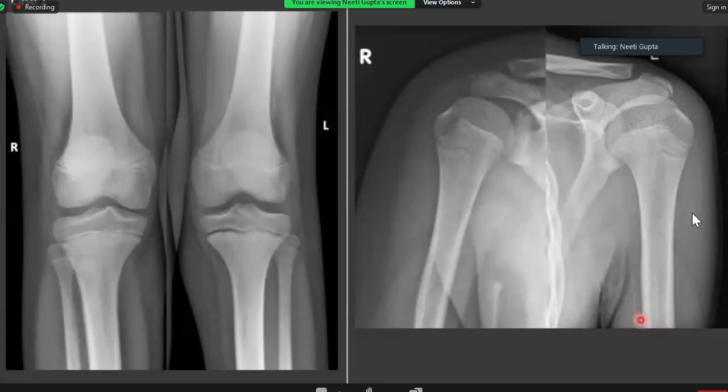Okay, so I'm sure now you're able to appreciate this physeal widening in this proximal tibia. In case 2, we do not mistake this as a fracture line. This lucency is just superimposition of the posterior physeal plate. The view is a little cranially oriented, so do not mistake this for a fracture.